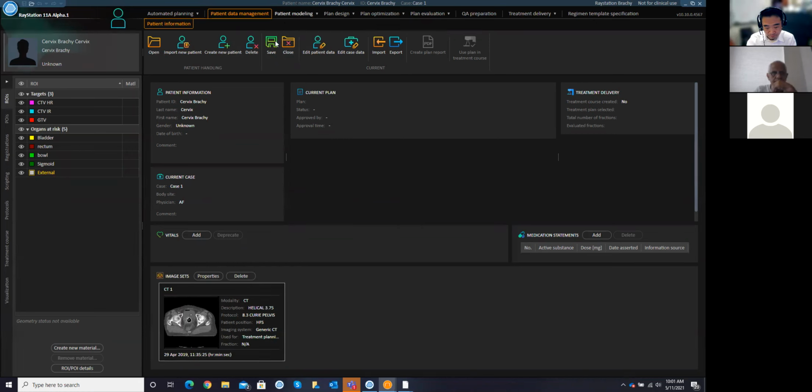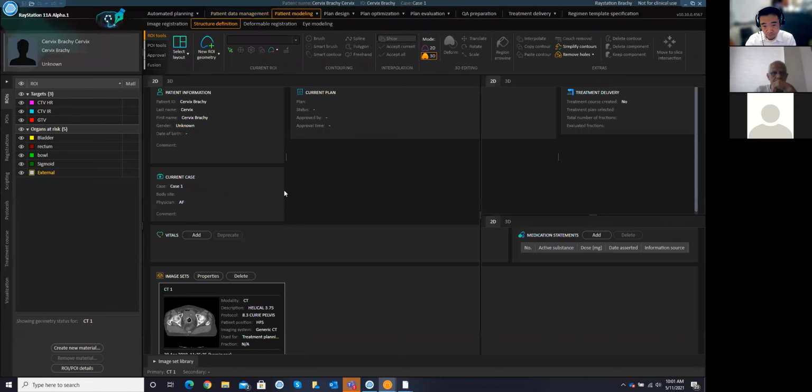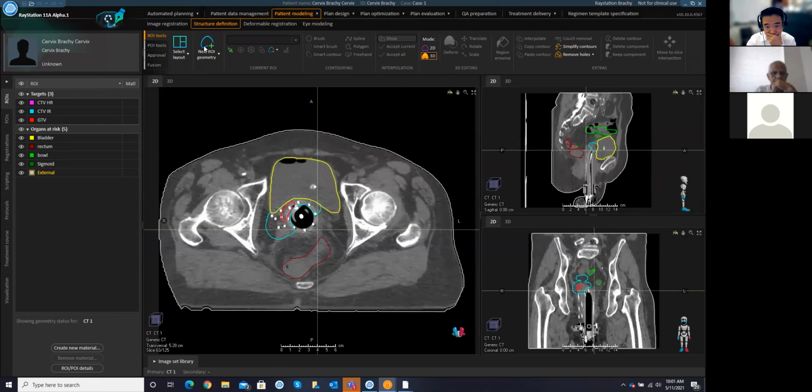And as Elin said, you have the options for contouring. You have 3 main auto contouring types. One is model-based segmentation. The other is atlases. And then you have artificial intelligence or deep learning. So the skills that your clinic is using for everyday planning can be utilized within your brachy.